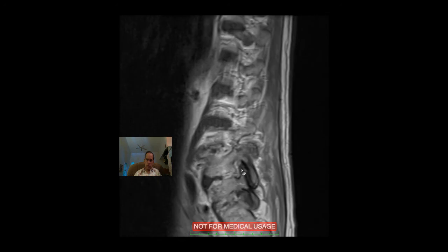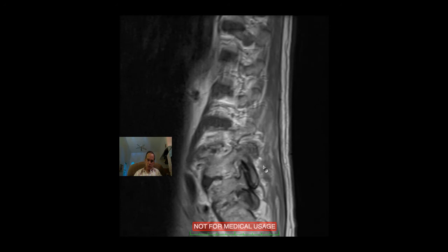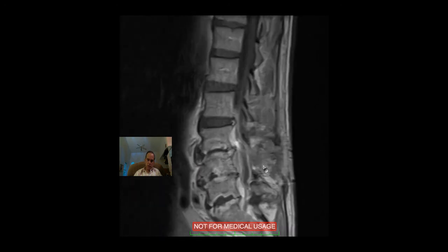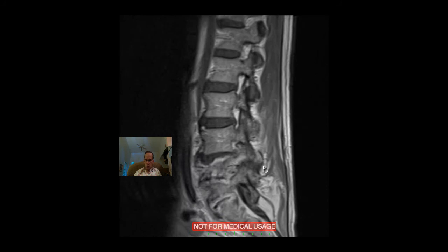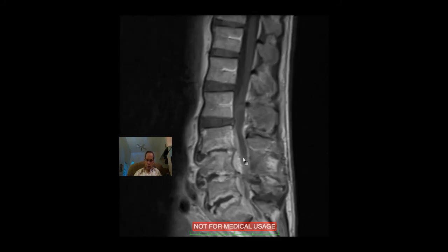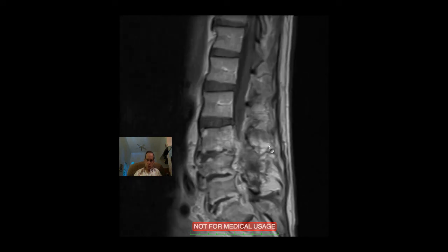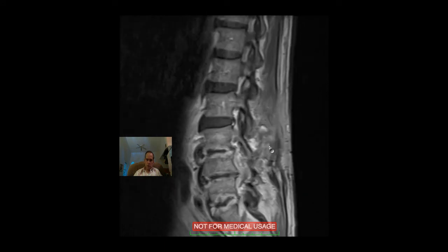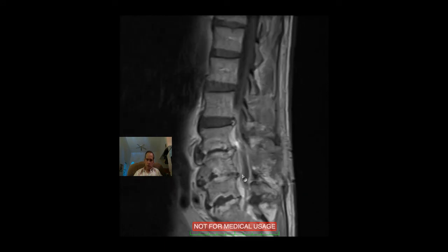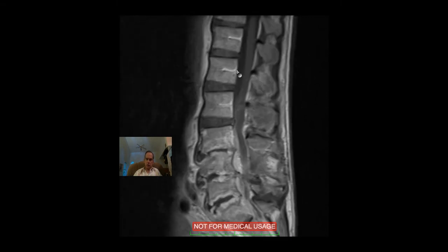Shows you how nicely the IV contrast enhanced studies can be at depicting a lot of the anatomy here. And it also shows you that if you go through it from right to left and you pay attention to the central canal, you see that there's far less cross-sectional area in these regions at 3-4 and 4-5 than there are, let's say, at these higher levels up here.